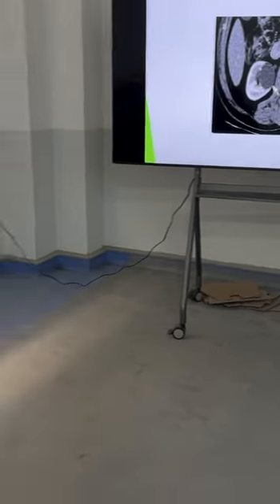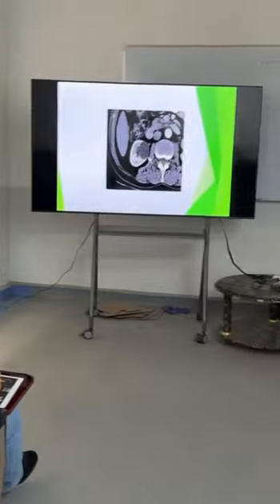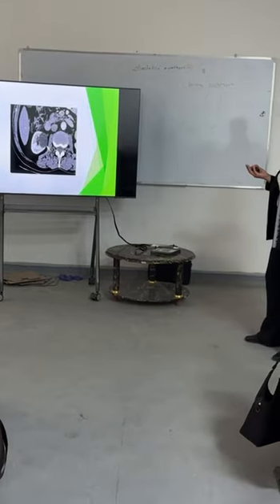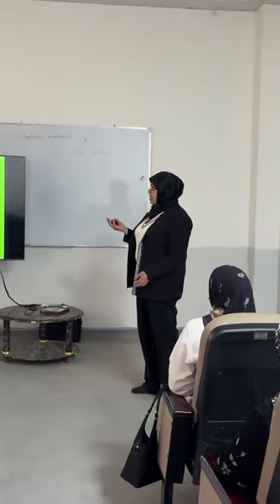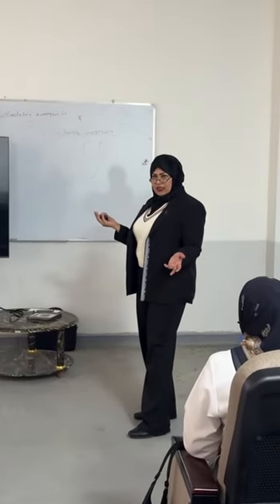Okay, yes. This is the right kidney. Excellent. Short, well defined margin. Hypodense or hyperdense? Hypodense lesion. This lesion is not taking contrast, so it is benign.